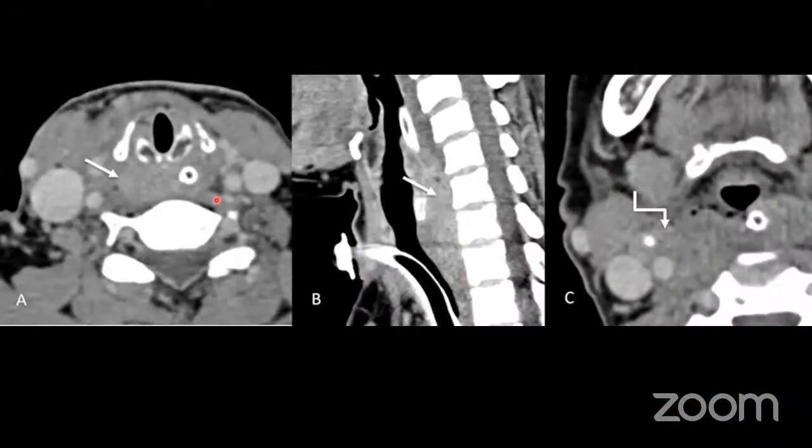This is a disease restricted to the postcricoid region, and in the axial sections, you can see that there is circumferential thickening of the postcricoid region, and it is important to distinguish whether the prevertebral fascia is involved or not. If there's a large volume disease, a prone scan should be done, or if still in doubt, it can be supplemented with an MR scan.